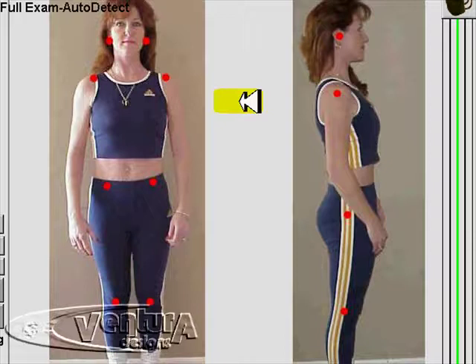You'll see in this picture we do have dots on the earlobe. We really prefer that you put the dots on clear safety glasses so that they will present themselves more toward the camera. It's also important that there's nothing else in the picture frame on the wall or on the floor that is the same color as the target color, and of course nothing in the clothing that would approximate that color. We have some examples in the instruction manual of good pictures and bad pictures that have been sent in to us from doctors who are having trouble with AutoDetect.